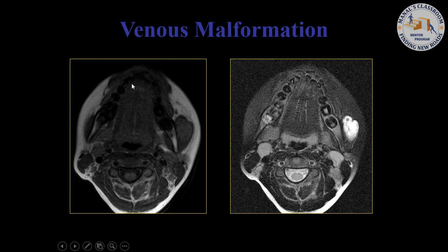So does anybody see the venous malformation here? Is it at A, B, or C? C, exactly right. So what muscle is this located in? And what space is that in? Thank you very much. Okay, you remember that. It makes me happy. Okay, I appreciate that.